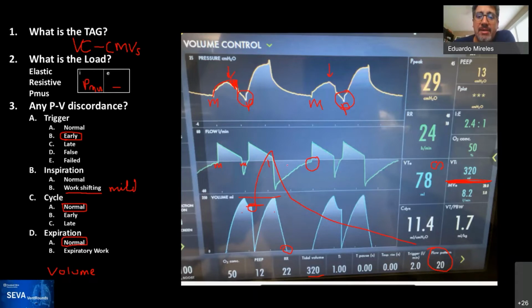So this is very, very distressing, I would say, in general terms, when we see this. So that's probably a call to our manufacturers to start thinking more intelligently about the alarms in the setting of patient-ventilator interaction.